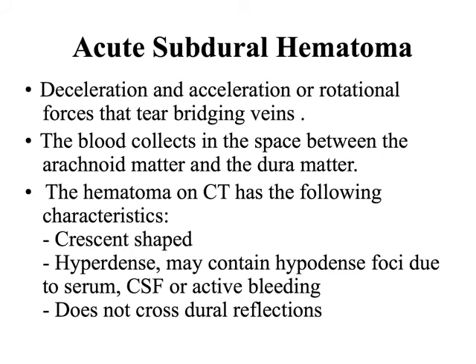So acute subdural hematomas can be related to acceleration, deceleration, or rotational forces, and it's going to tear veins within the dura mater. The blood collects in the space between the arachnoid mater and the dura mater.